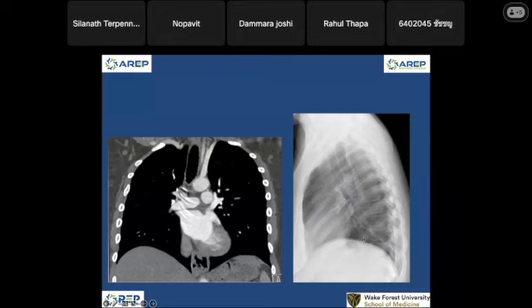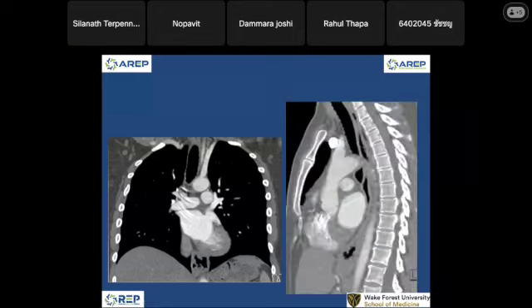This is the same person, and the study was done not so long apart. Sometimes you see it, sometimes you don't, depending on whether it's sliding at the time we do the chest radiograph. It will not be there all the time unless it's really big. The small one can move up and down, but the big one will always be there. Like this one is pretty big. This is an example of hiatal hernia, and good that you picked up the stomach rugae. This is the stomach.